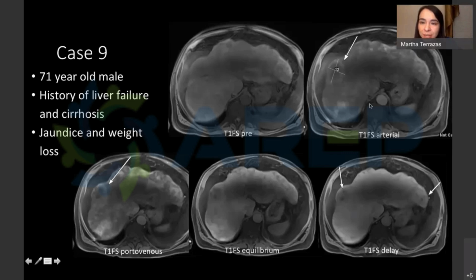So we look here and just look at the liver contour, and this was actually pointed out by my attending when I had read this: it doesn't look like a cirrhotic liver morphology necessarily. It's really lots of areas of capsular retraction. And then you start to look and you're saying to yourself, hey, is this a lesion right here? Is there another one here, another one here? So what we have is all these lesions in a peripheral or subcapsular distribution with capsular retraction. And then on delayed phase imaging, it's heterogeneous, but you have this increased enhancement.